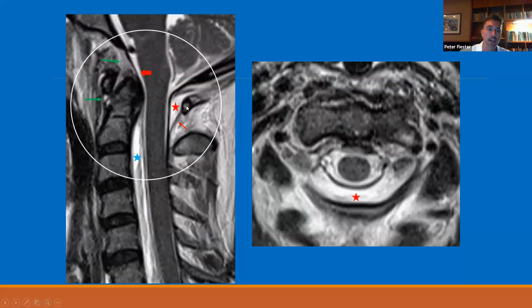This is a kind of finding that we've noticed in a bunch of patients in which the posterior atlanto-occipital membrane, if you remember, forms a myoligamentous dura bridge. So it attaches to the dura at C1-2, and you can strip it off. So this is the membrane that's been stripped off the dura, and it forms this little dorsal epidural effusion here. Sometimes you can see it on CT, and it's much clearer here on MRI, and it's indicative that the posterior membrane complex has been compromised or torn.